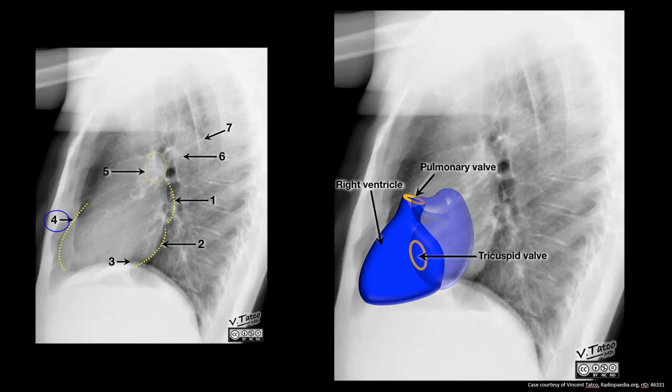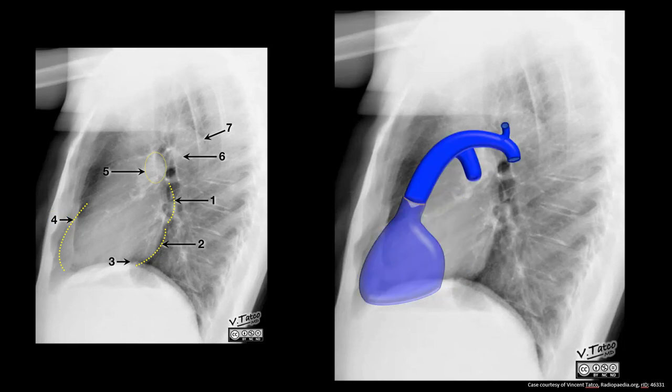Blood exiting the right ventricle, going out that pulmonary valve, and then it goes through that trunk and then off to the right and left pulmonary arteries. Number 5 is going to be where it just goes straight over, more lateral, that's going to be the right, where number 6 is actually an arch, where we can see that as the left pulmonary artery. So 5 is going to be the right, where it's just traversing straight across to the right side, where the left, we can actually see it going a little bit more posterior, so it creates more of an arch.